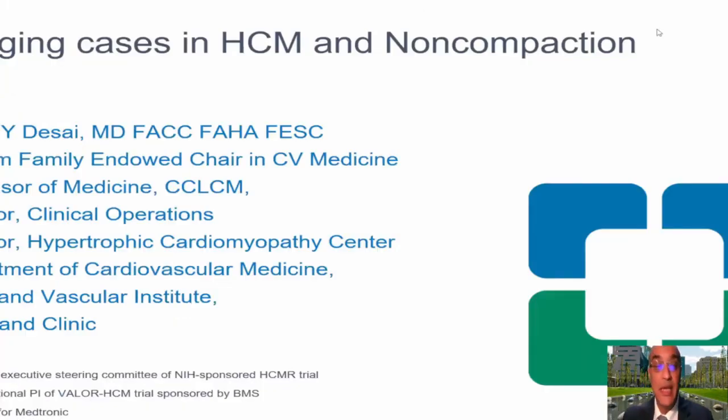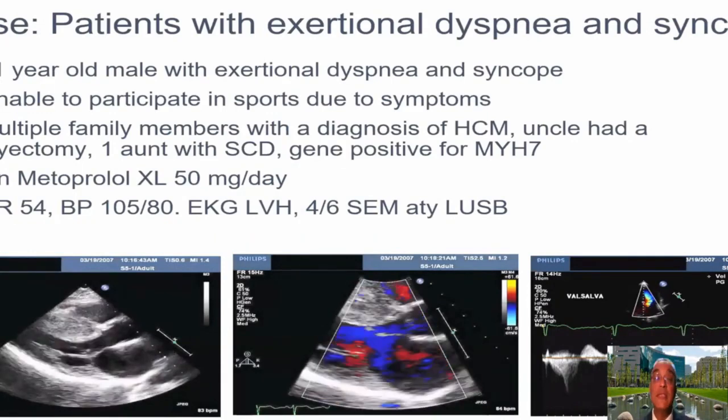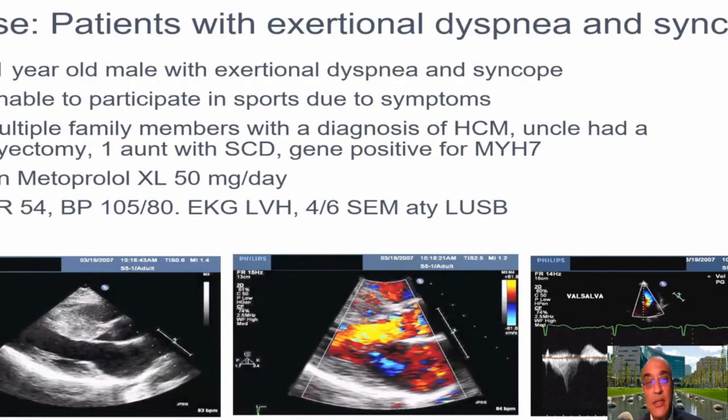My name is Milind Desai. I'm from Cleveland Clinic in Cleveland, United States. And I've been tasked to talk about a few cases related to hypertrophic cardiomyopathy and non-compaction. Here are my disclosures. So we will start with this case. All these are my patients that I've seen over the years.